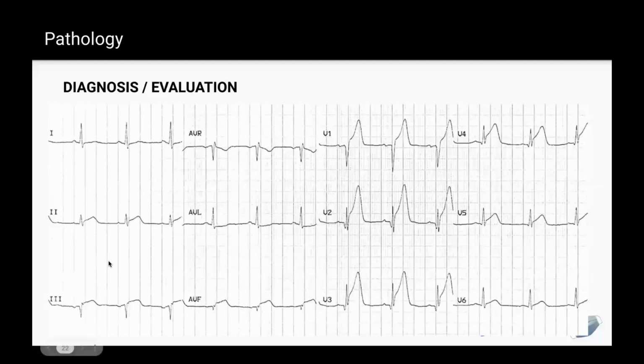Let's look. Maybe a little here. It's not super high, but yeah, it could be a little bit. 5 and 6, maybe a little bit.